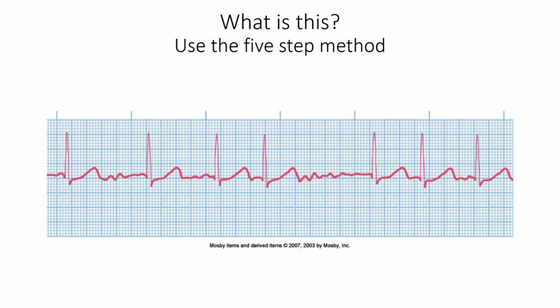Okay, so I want to practice a little bit. I'm going to give you probably 30 seconds to look at this, and we want to do the 5-step method. I want you to look at it and think about what this could be, because you can't tell me obviously, but we're going to do the 5-step method.